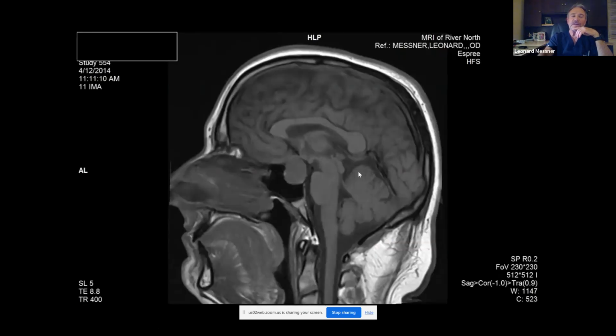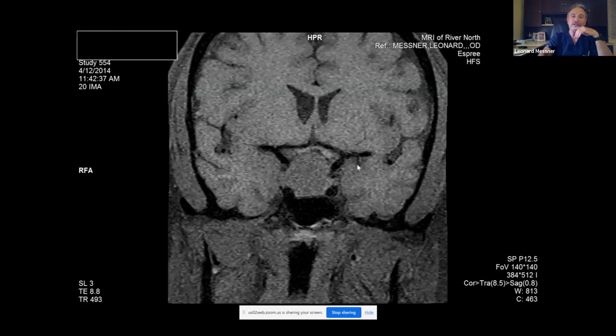And this is why, looking at this individual's chiasm, I'm going to cut straight to the good stuff. And here is the chiasmal bar that has been deviated upward. This is a coronal cut through the chiasm. This large isodense lesion, this mass that you see below, that is a pituitary adenoma.